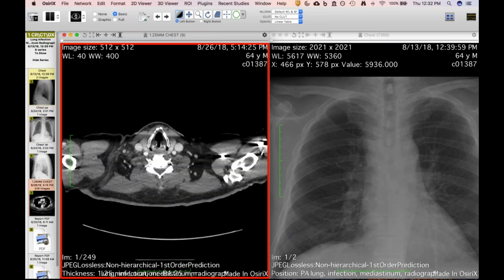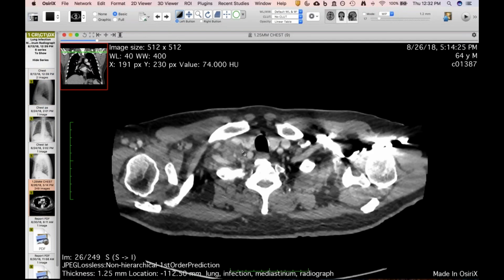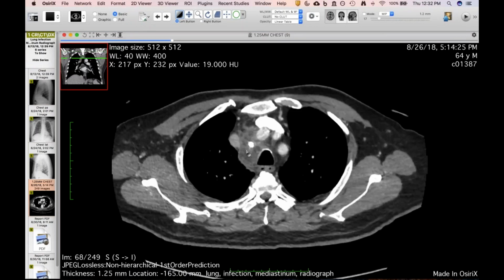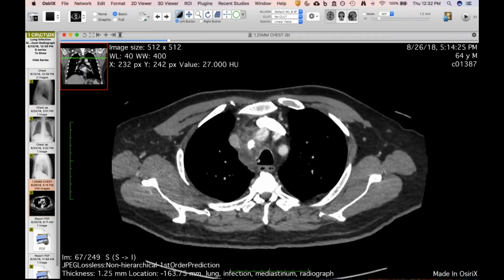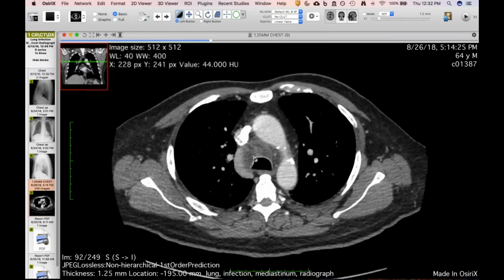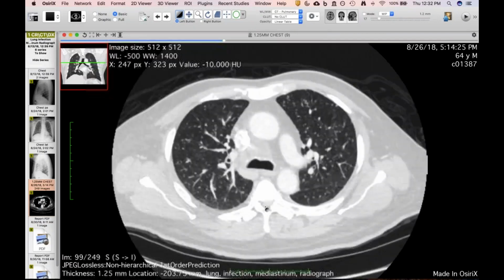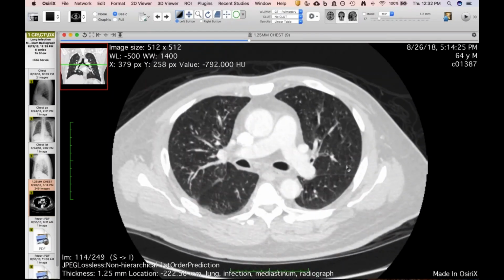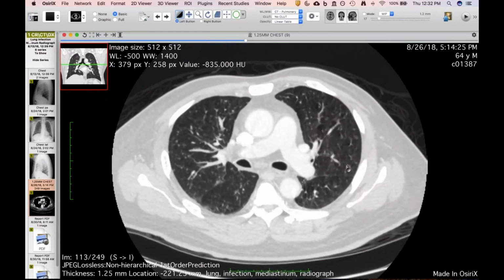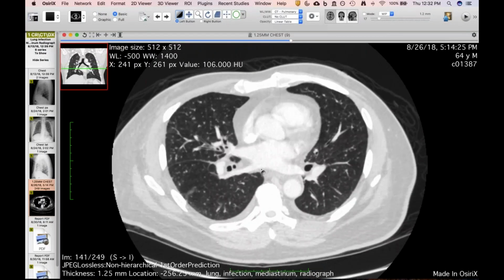But wait till you see the CT that was subsequently done, and you'll see that in fact there is a big necrotic supraclavicular node right here. And then there's also just this huge bulky conglomerate of necrotic right paratracheal lymph nodes going down, that whole area, as you correctly said, Howard. And then check out the lungs. And this was only 2 days after that radiograph. So miliary pattern. And there was a CT from a few months ago, and no surprise, no miliary nodules.